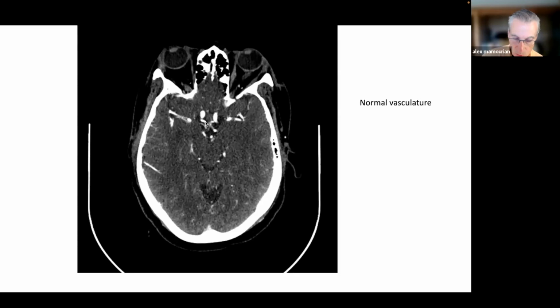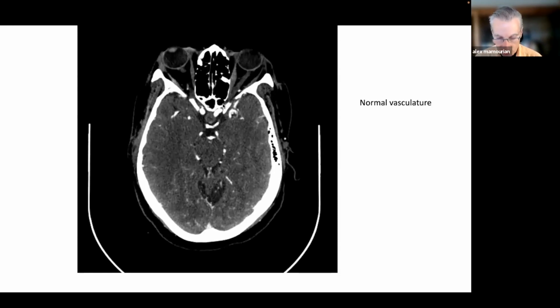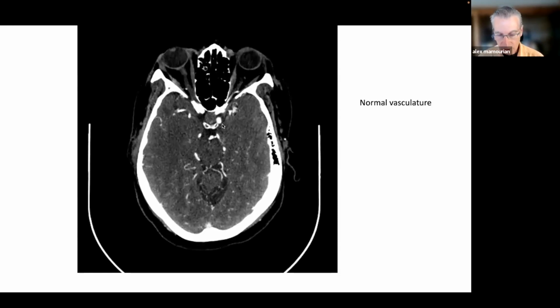These are the posterior communicating arteries, right and left. The posterior communicators, of course, come off the carotid artery. They're the second large branch that comes off the carotid. These will join with the proximal posterior cerebral artery, and these divide the posterior cerebral into P1 segment and P2 segments. And again, here's the optic strut defining the dural ring.